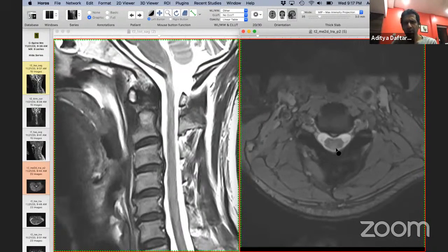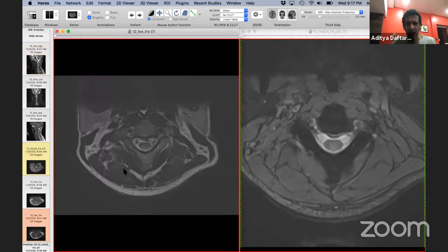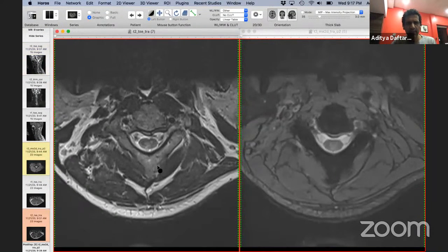Sometimes we do, but when you do it, the big thing that you'll see is if you see this bone here, it's very dark and it looks almost like it's blooming out. Whereas here on a T2 weighted image, you can see nicely the differentiation between the cortex and the medulla. And that differentiation is harder to see on a gradient echo image. So I think that is an important thing to do. I hope that's clear.